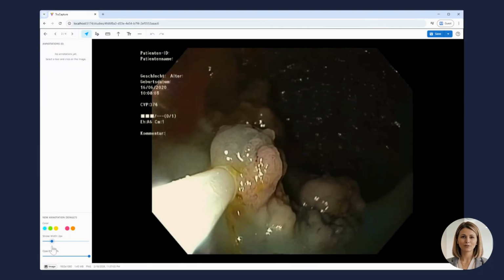We also put powerful tools at your fingertips, from annotating the image captures to creating key images from video material. Rulers, points of interest, arrows, and text. The editor is simple to use and powerful. No more scrolling through folders on a shared drive. No more wondering where an image went.